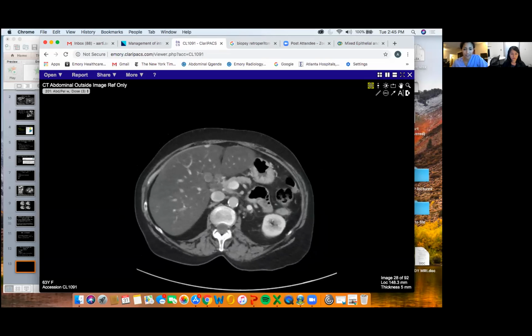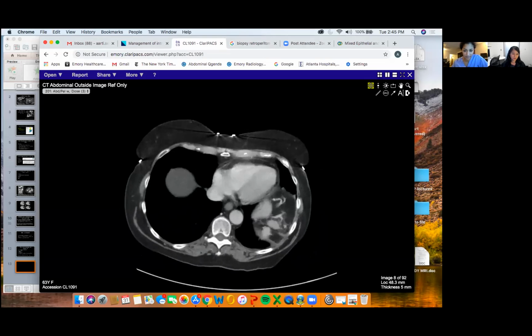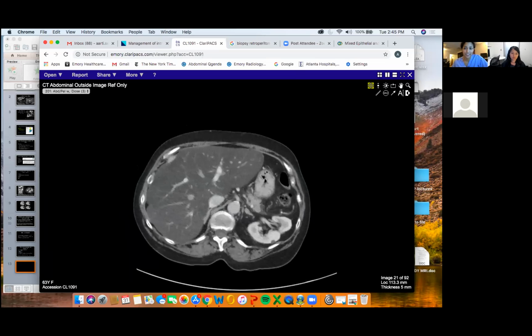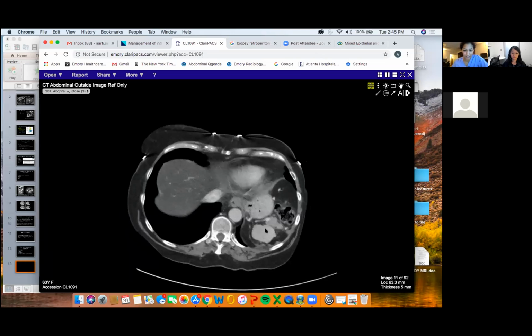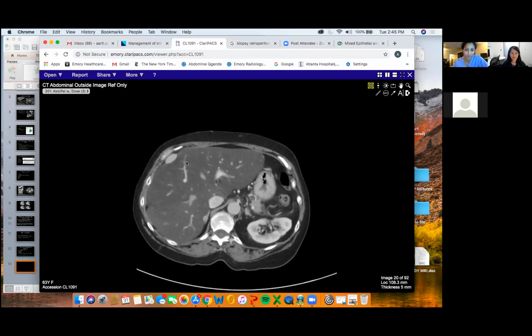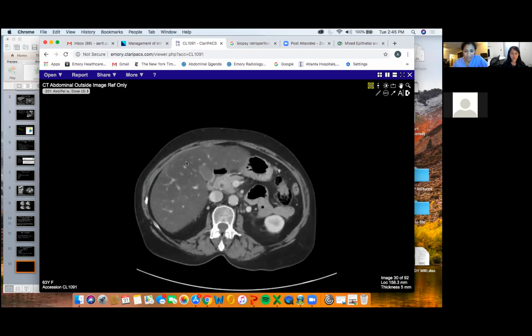So does anyone have any ideas what these could be? Worry about metastatic deposits or maybe splenules. Yeah, I just looked at the spleen as you scrolled up there. Yeah, I was trying to show you guys exactly. So Amar also got splenosis, and GW also did. So good. The clue is that there's this weird spleen up here, and that these are very, you know, kind of lenticular, avidly enhancing. They're random. So I just want to show you a few more images.